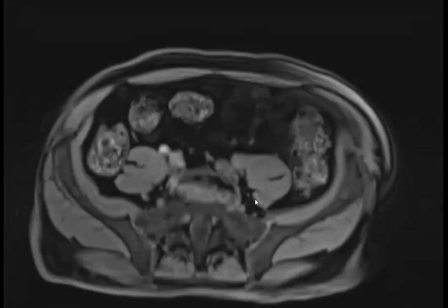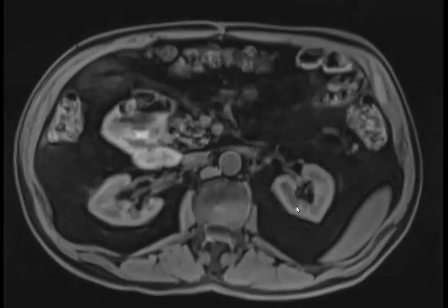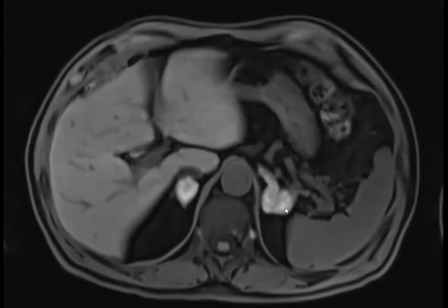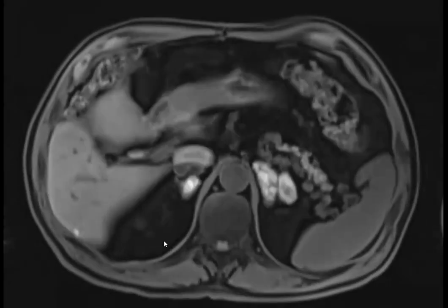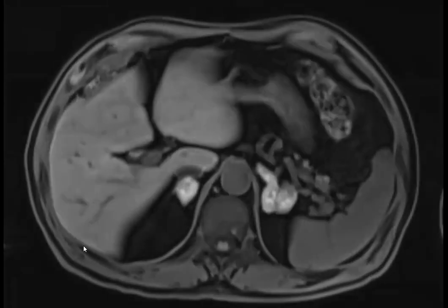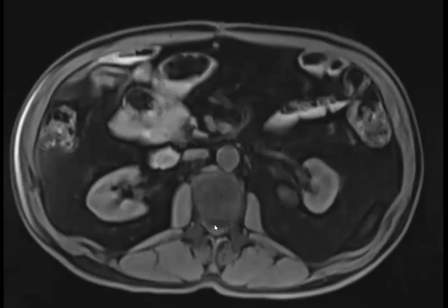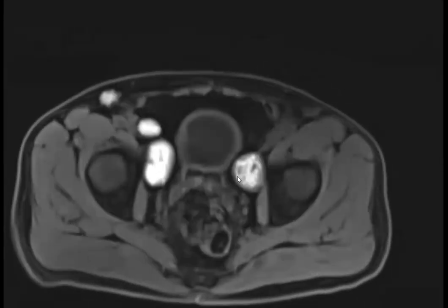So what do you guys think? Melanoma. Good. So this is almost a little bit reminiscent of that endometriosis case, right? Super multifocal T1 bright, but really weird distribution for endometriosis. Adrenal glands would be very weird, although not impossible. You do have a little bit along the liver. So if this was a female, maybe thinking endometriosis. And then these are all in a lymph node distribution, which would not be typical for endometriosis.